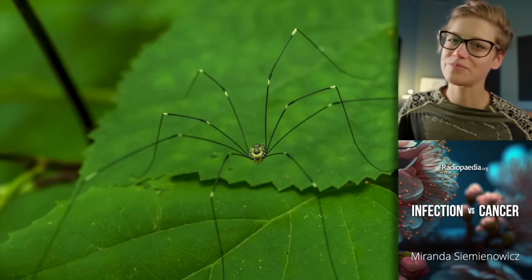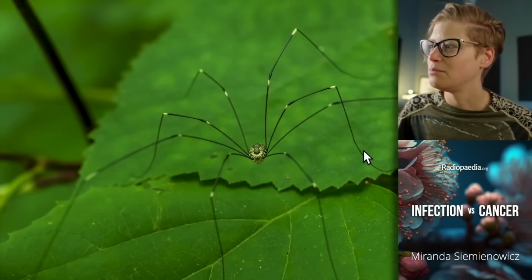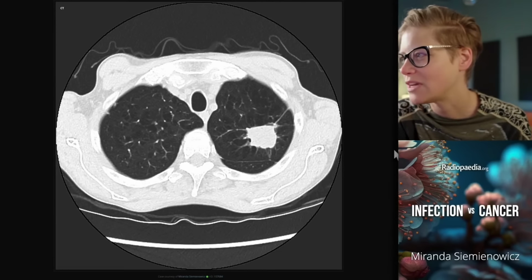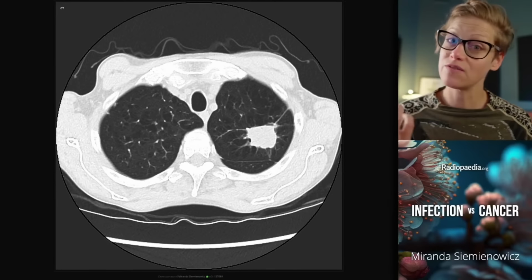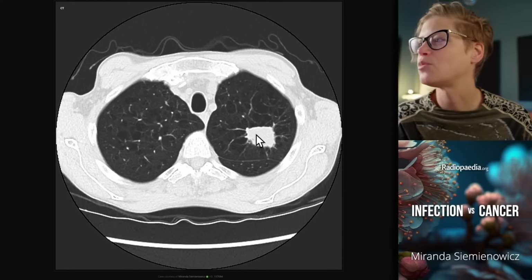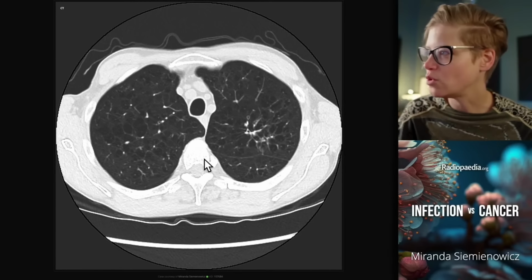Benign radiations are sparse, they're more spread out, they're often longer, and they're often angulated because they comprise the normal background lung architecture. So here we have a focal opacity in the left upper lobe, a patient with moderate centrilobular emphysema, so their risk factor for malignancy, risk factor for pneumonia. And when I scroll up and down through this lesion, I see multiple sparsely spread radiations, many of which are quite long. So let's go all the way down to the bottom and just work our way back up.